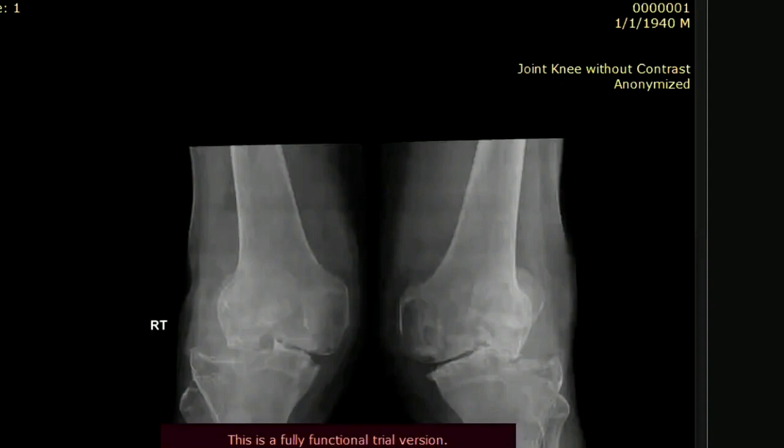Both sides of the bone are involved, and no soft tissue swelling is noted. I cannot appreciate any periosteal reaction. The cortex is irregular, however, I cannot see any cortical break. Subarticular cystic areas are also noted, and there is periarticular osteopenia. The diaphysis and the metaphysis of the bones are normal, and the visualized fibula is normal.